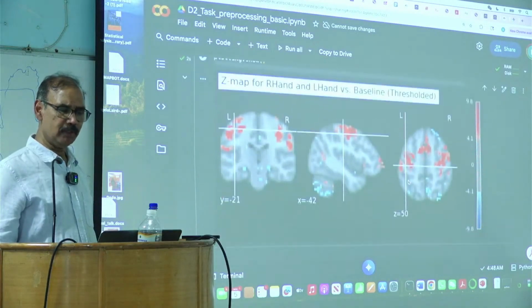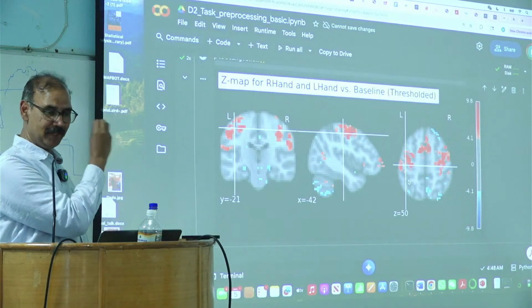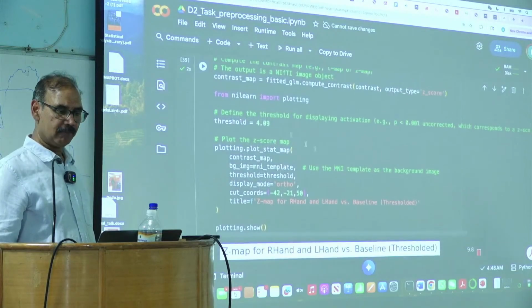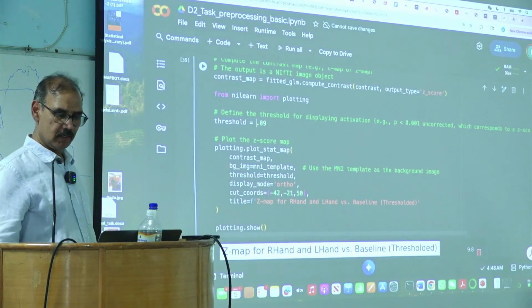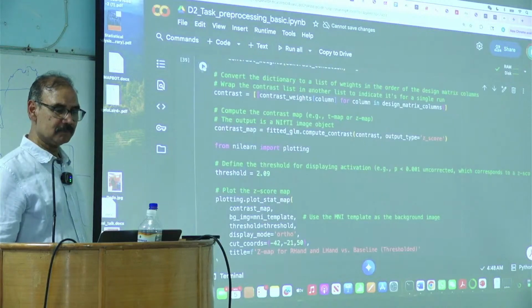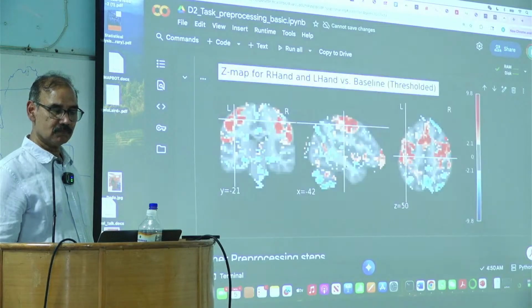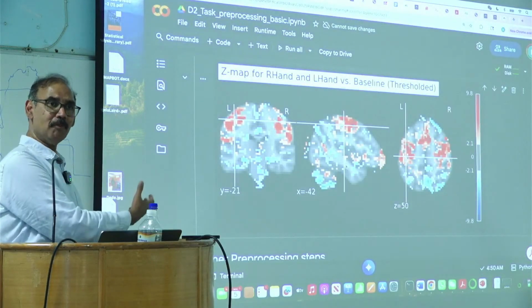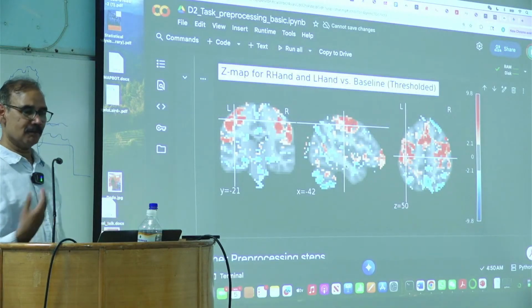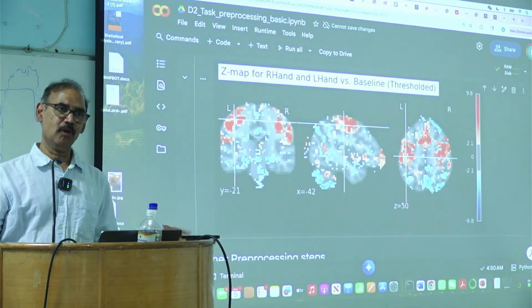So this one looks good, right? Very distinct ones. And if I used, let's say, 2, so much more, right? So much more red voxel, so much more blue voxel. Which threshold would you use?